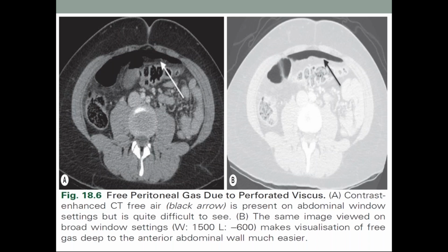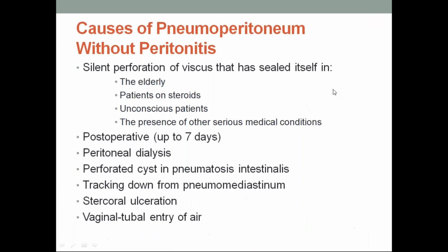broad window. Actually, in the broad window you will see free air clearly. If it is present, it will be clearly seen in the broad window settings. It is a little bit difficult for you to know which window this is. Okay, I will skip it.